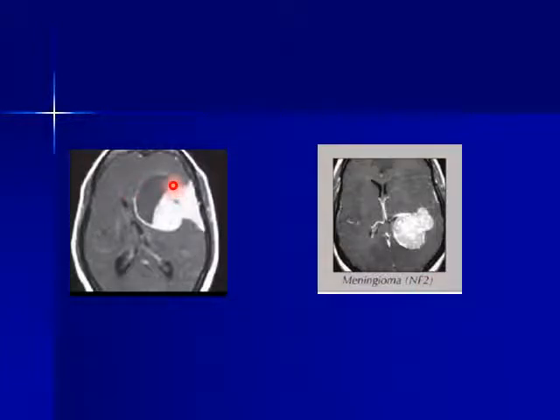Sometimes meningiomas may be accompanied by cysts. These can be either entrapped CSF, as if they are forming a secondary arachnoid cyst, or the meningioma itself has tumoral cysts, and there are some types of meningioma which contain these cysts, called the cystic variant of meningioma.